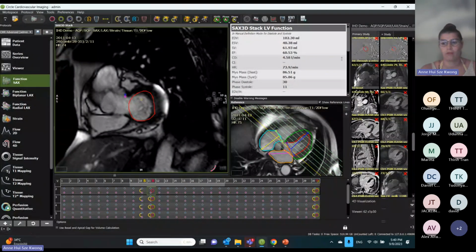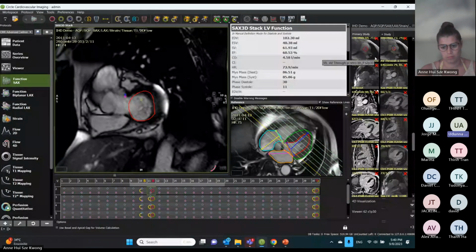Okay. And yes, when you have contours, you see that when I drew the 2D flow, I can now see my contours on the image as well. Yeah. And so when you apply it, it will apply all of the other contours, because this is a missing contour. So when you do one, do you have to do this for all of them, for the blue, the pink, and the yellow?